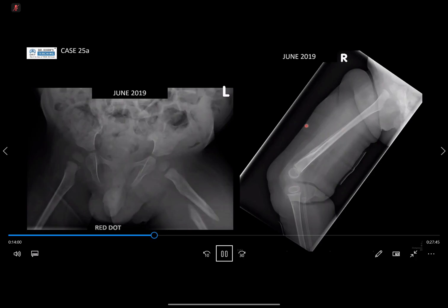There's a laminated type of periosteal reaction in the visualized femur. Okay, and then how about the left hip or the left leg? So, in the left leg, there's a fracture of the left femur, which is an old fracture because there are corticated margins along with the periosteal reaction, and there's evidence of soft tissue around that. So this could be a pathological fracture on the left side.